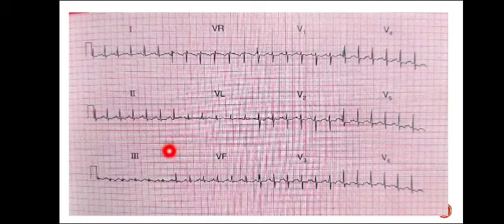But one important thing that we can find over here is that there is basically a biphasic T wave. Here you are seeing inversion, and here you get an upward deflection. So biphasic T waves you can find in the inferior leads.